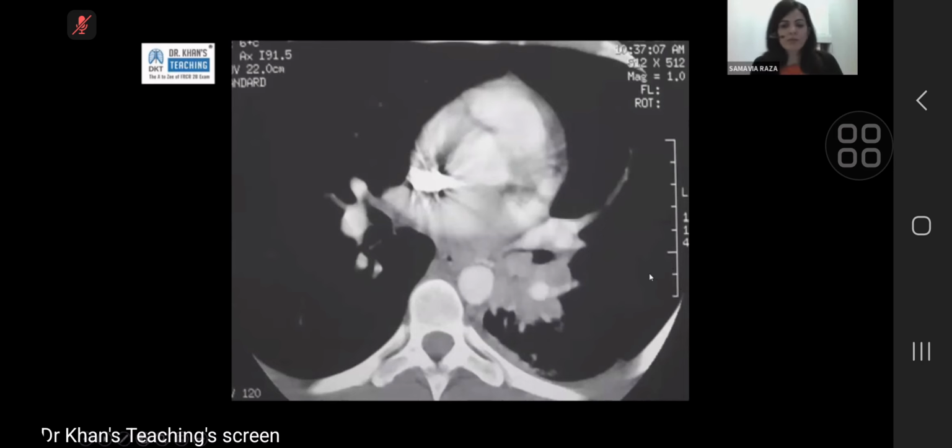This one, I want you guys to tell me whether you think this is a primary lung cancer infiltrating into the bronchus or the other way around, or is there no way of knowing? And what else do you see on this that tells you that this is metastatic? This is a primary that has metastasized, is what I mean. And I promise we'll stop in a couple of minutes.